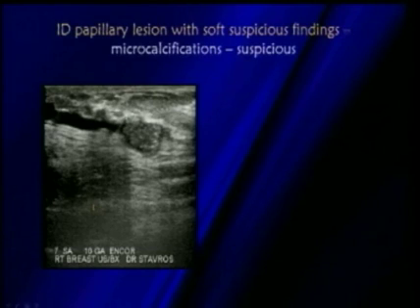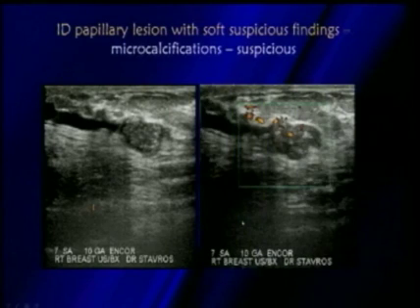Once again, because of the high water content within these lesions, a lot of times you're going to see enhanced through transmission posterior to these intraductal papillary lesions.